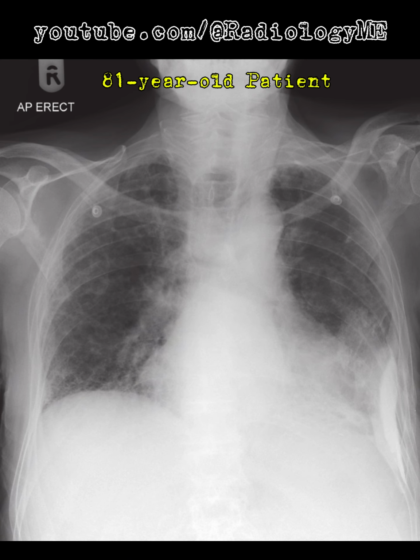Now, thinking about the exam, you might be asked about the key radiographic features of asbestosis, or even how you differentiate this from other lower zone interstitial lung diseases. I'd focus my answer on the presence of pleural plaques, the symmetrical basal fibrosis, and the occupational history, which are all critical points. You'd want to highlight how this differs from conditions like idiopathic pulmonary fibrosis or lymphangitis carcinomatosa, which can sometimes present similarly but have different causes or patterns.